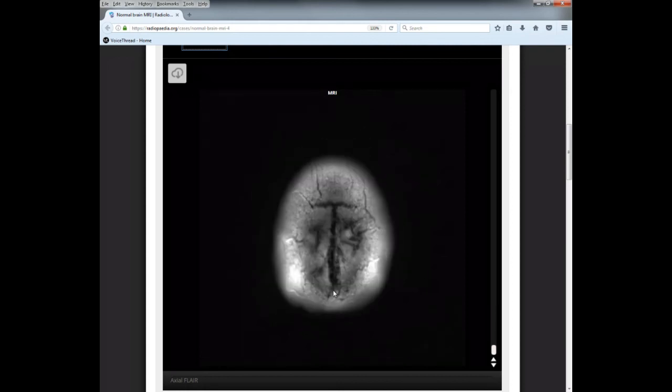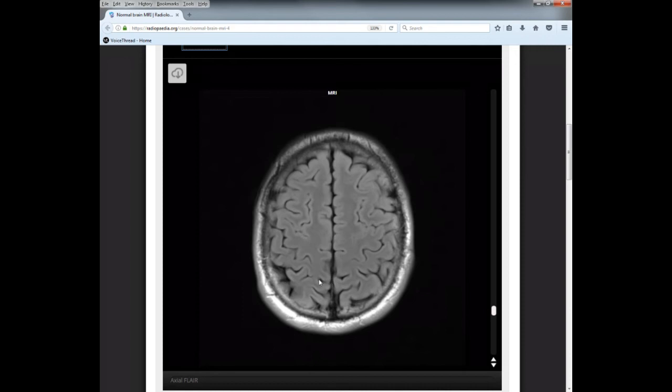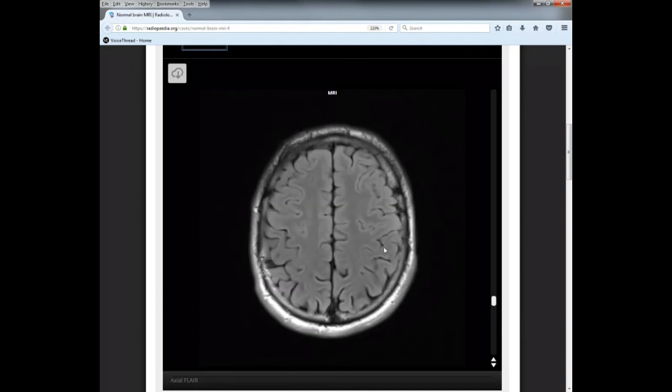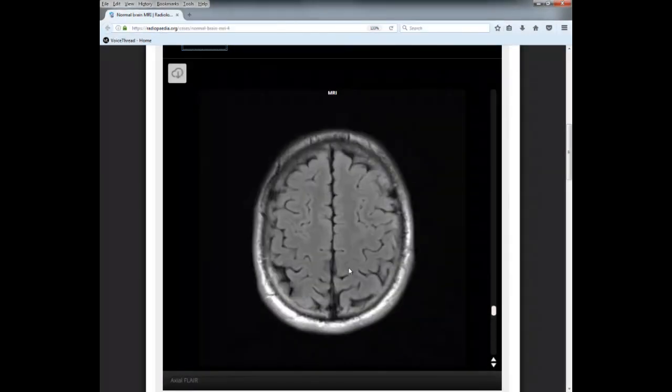So up to the top, go down, look to the lateral aspect of the longitudinal fissure, cingulate sulcus, up and to the left, up and to the right, there's your central sulcus, okay? And he's actually got a really easy one that you can follow up one more slice, okay? Cingulate sulcus right here. And now that I know where my central is, this is cingulate, this is cingulate.